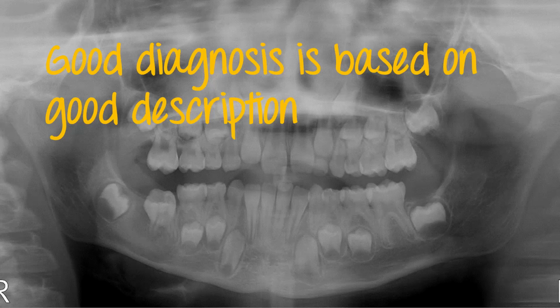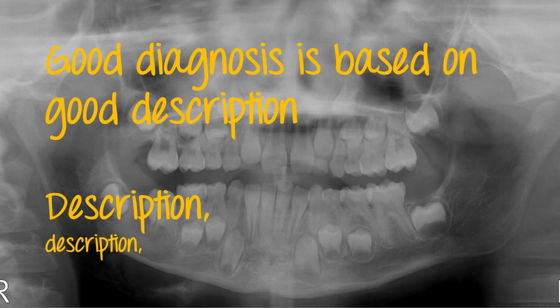This time is worth investing. Remember that in real estate, the 3 key words are location, location, and location. In radiographic interpretation, the key words are description, description, and you got it, description.